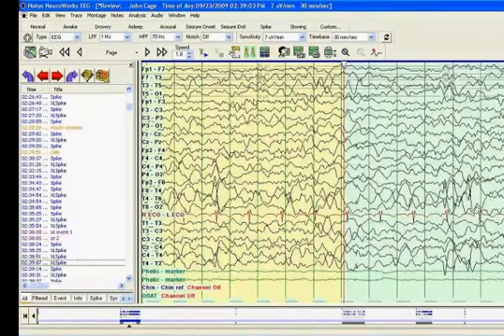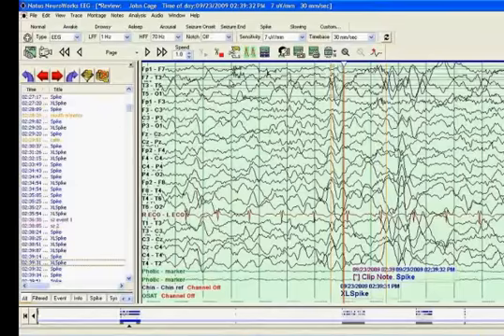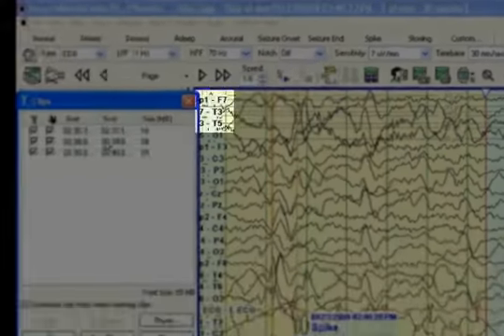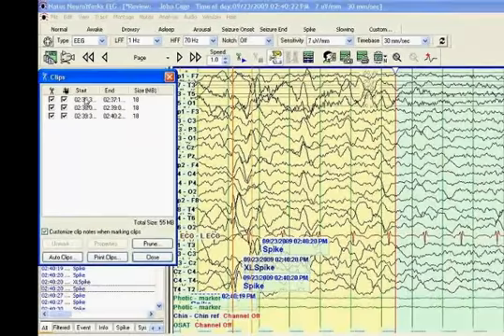And mark an end point. And I can continue scrolling, marking a start point, marking an end point. Now, if I click on the third button that says Edit Clips, it includes all of our clips here.